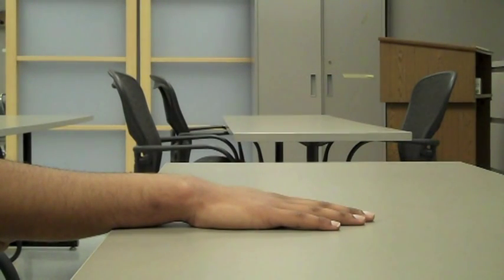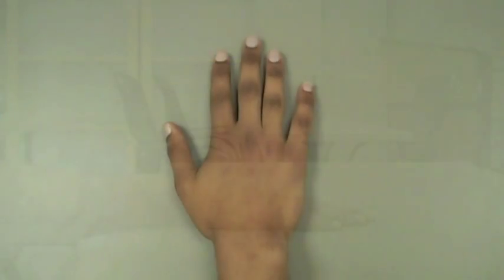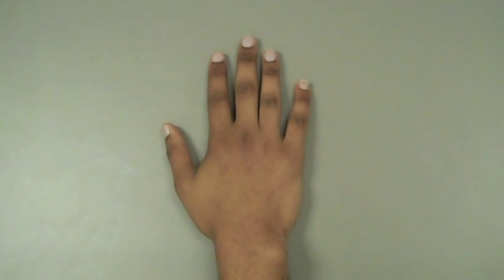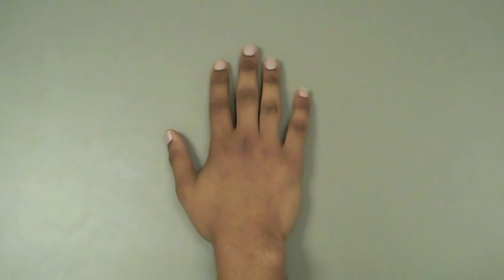As you can see, you will first notice the wrist is in a neutral position. The wrist is aligned, neither flexed nor extended. The 5th digit should be approximately aligned with the styloid process, so it's neither ulnarly deviated or radially deviated. The fingers are aligned, neither flexed nor extended.